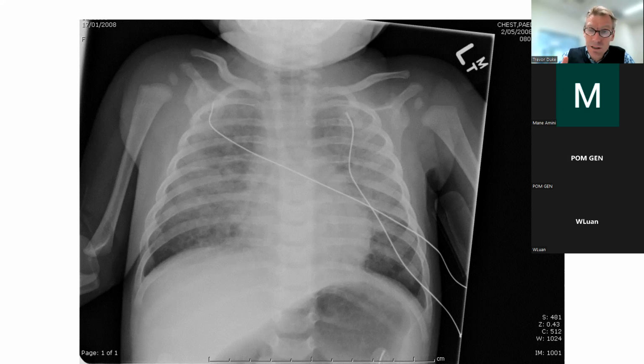That's right. The features that make it look more like pneumocystis, rather than viral pneumonitis, are that there's a bit more dense consolidation. It's not lobar consolidation, but it's a bit denser than you expect with viral pneumonitis. And you can see the almost patchy sort of nodules throughout the lungs. So this was a child who had chronic lymphopenia, low levels of lymphocytes, so immunodeficiency, not due to HIV, but had pneumocystis jirovecii pneumonia.